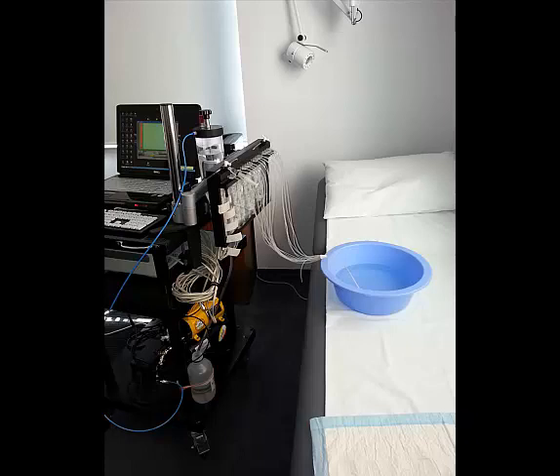Before recording a study, you should set up the manometric perfusion pump, ensuring that all channels are filled with water and are perfusing, preferably with the catheter attached and placed in a bowl of water. Ensure that you have a recent calibration file available.